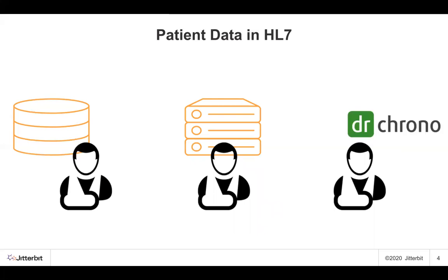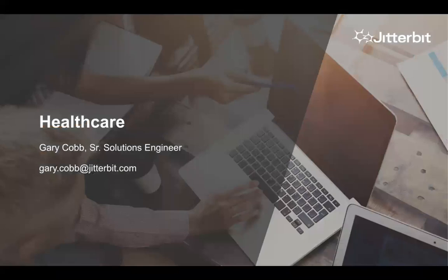Now, we've been working with the HL7 ORU format. However, I will mention that we can certainly work with any other type of HL7 document that you might be working with. If you have any questions or would like to see any further examples, please feel free to reach out to myself, gary.cobb@jitterbit.com, or your Jitterbit representative, as we'd be happy to walk through your specific use case and give details around further functionality.